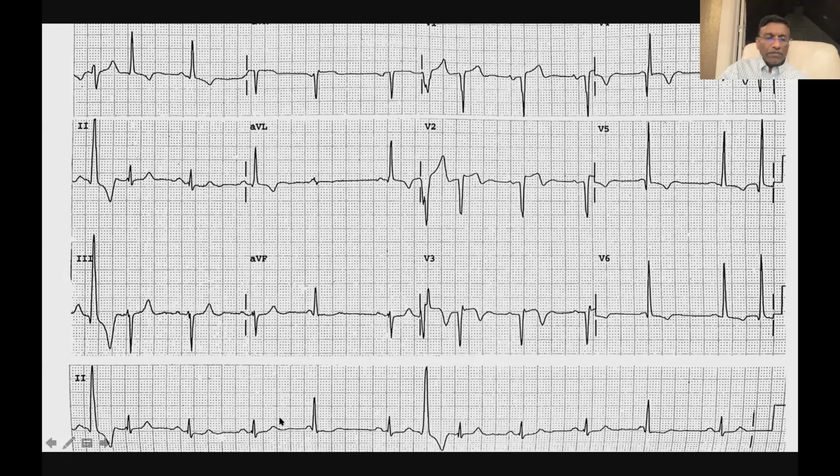And whatever this conduction system does, it's not able to penetrate and reset that focus. And that's why it always fires on time. So then you're going to ask me, why didn't it fire here? So you walk this back. If that's the interval of the parasystolic focus from here to here, then the next interval is going to fall about here, and then the next interval about here.